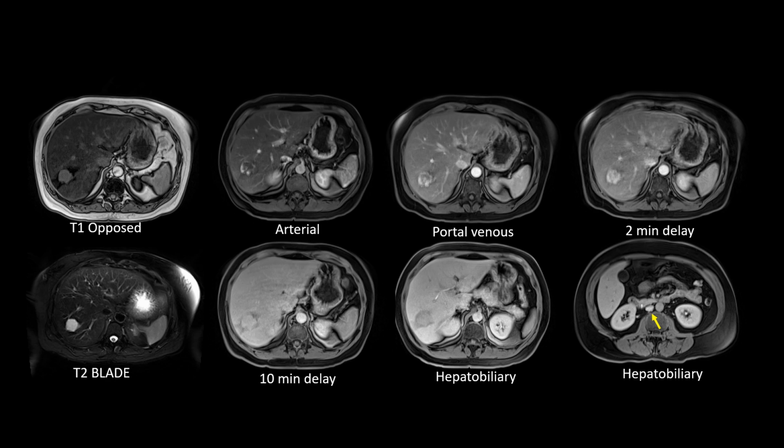Here we have another mass, again, right hemiliver.